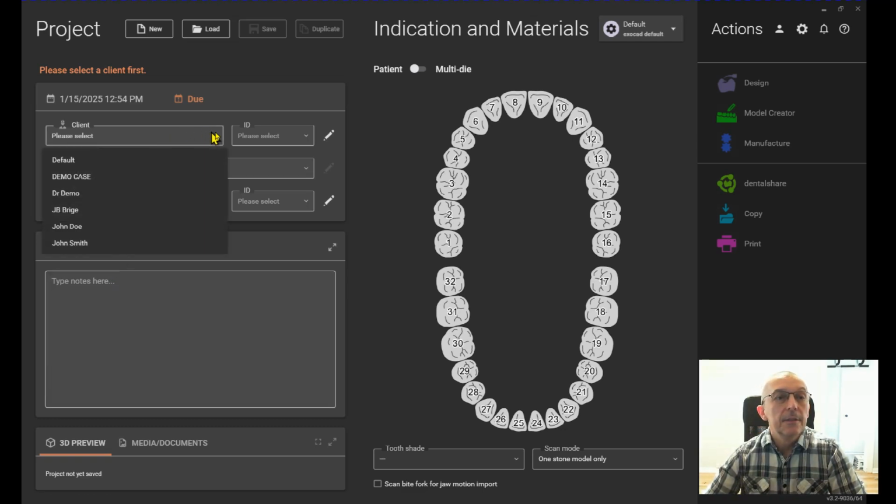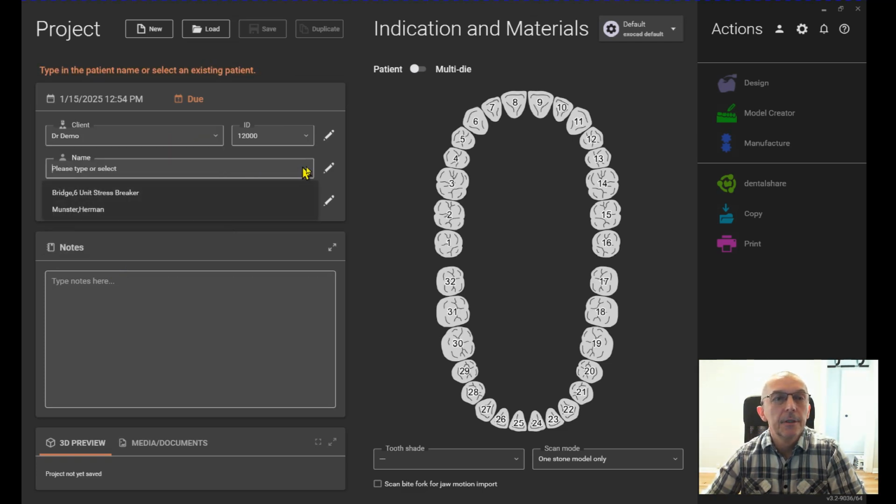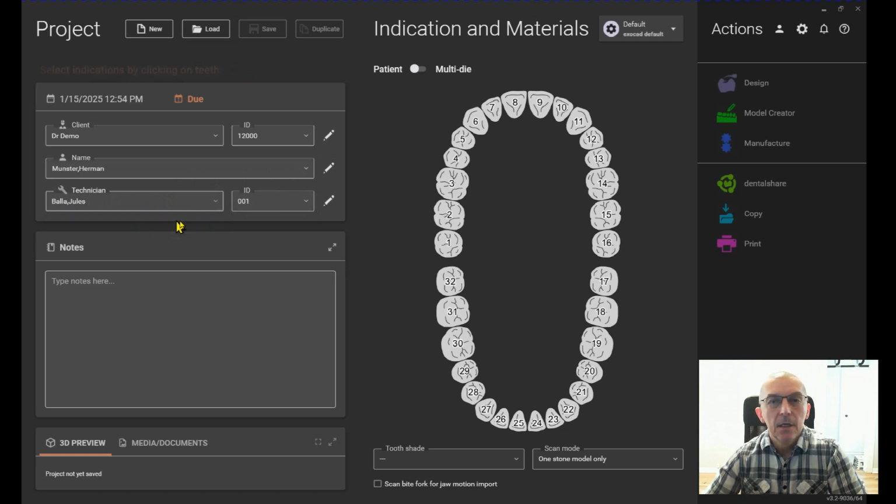So let's choose a doctor. We'll say Dr. Demo, and then we'll go through a patient. Let's go with Herman Munster, since we already did this patient, and then the technician would be me, and you can add yourself to it in this area here.